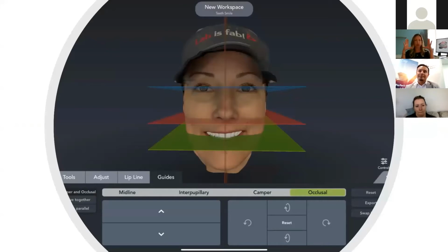We've got the patient photo, the eyes, the smile display, the center line, and obviously all the planes, and we've been rolling that into the software when we're designing. For immediates, it's such a no-brainer. It takes a little while to get used to, but I would highly recommend you start tinkering with this as well. That's a whole other lecture.